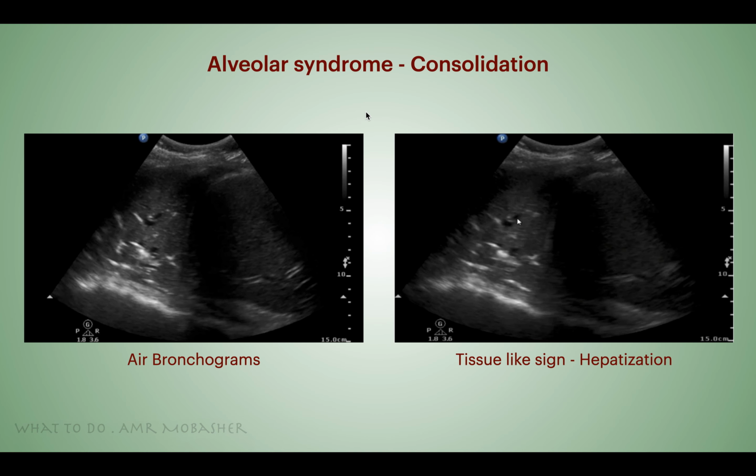Alveolar syndrome, or simply consolidation. So in pathology, in third year of faculty of medicine, the alveoli should be vacant spaces filled with air. If there is pneumonia, they will be inflamed and filled with inflammatory cells. So it's going to be hepatized. That's what's happening on ultrasound exactly.